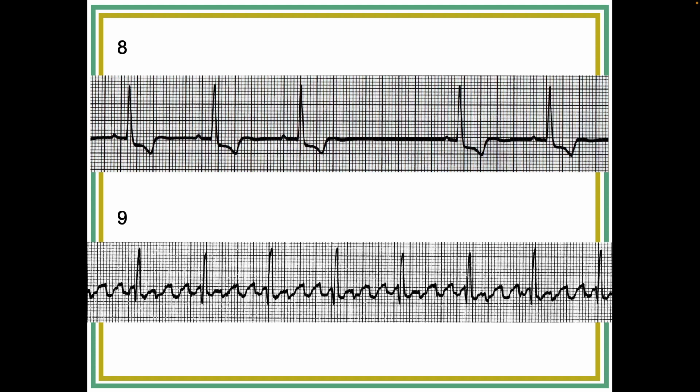PR intervals look normal. Same with QRS complexes. T waves are inverted. And yeah, so sinus bradycardia with, is that a sinus pause?